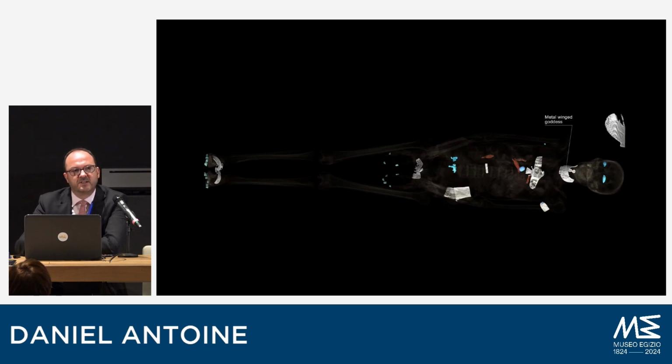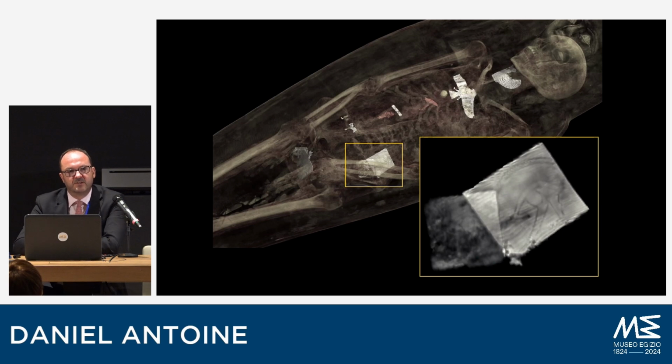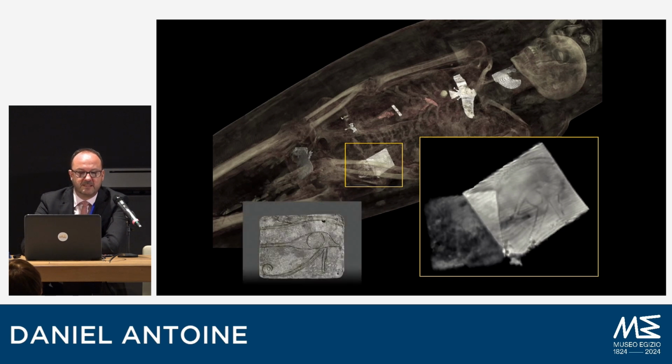And these visualizations are about a minute and a half. I'm not going to show the whole length, but it's just to give you a flavor. And the dual energy is making a big difference. For example, the incision plate here, with single energy, we wouldn't have picked up the fact that it has an eye of Horus. You can see it quite clearly, but actually we wouldn't have picked up there's actually two incision plates, and the second incision plate also has an eye of Horus. So really, this dual energy is really improving what we're able to see.